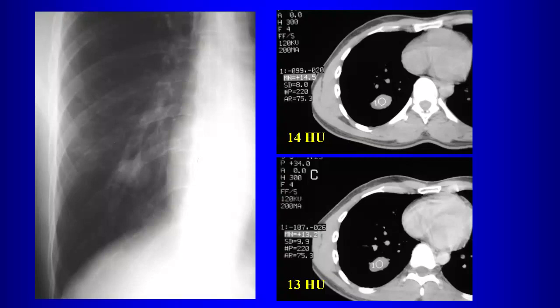What if it were in the liver? What infection gives you a well circumscribed fluid collection in the liver? Hydatid cyst. Can that occur in the lung? Yes. So a hydatid cyst could also give you a lesion like that in the lung parenchyma, a well-circumscribed fluid collection like that. This was an intraparenchymal bronchogenic cyst, though.